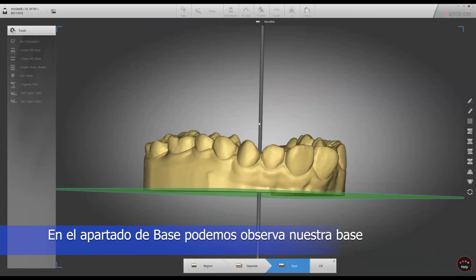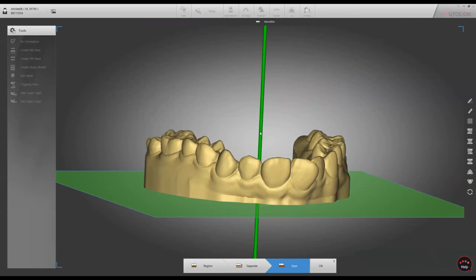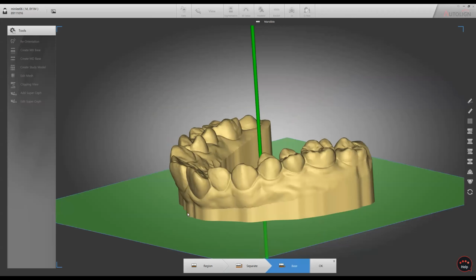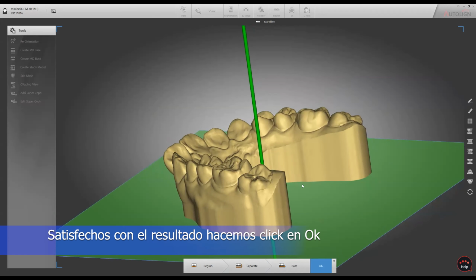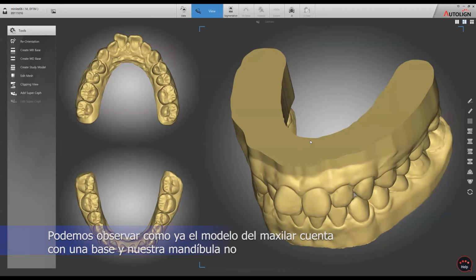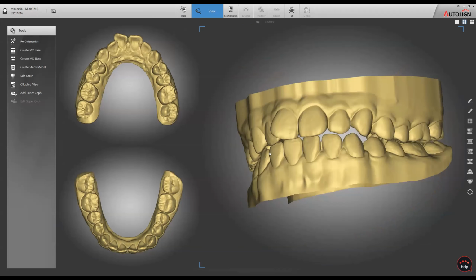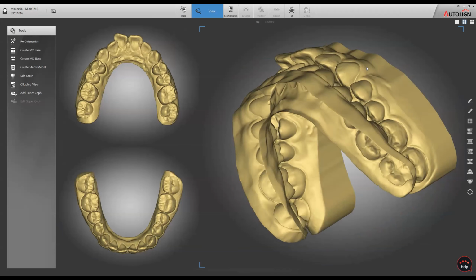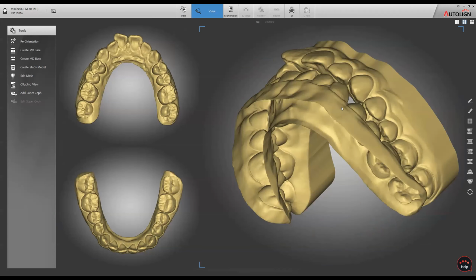And if you click the base, we can choose the height of the base. And when we export the file, we'll be able to set it again. So you don't need to worry too much about the height at this stage. And click OK. So we have the base. And normally, it is best to create the base if you're doing the hollow model from the mesh mixers.